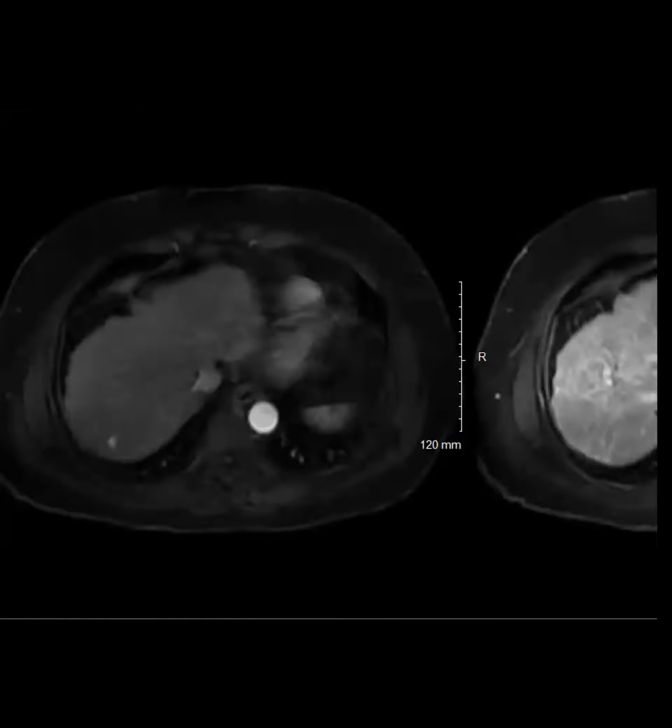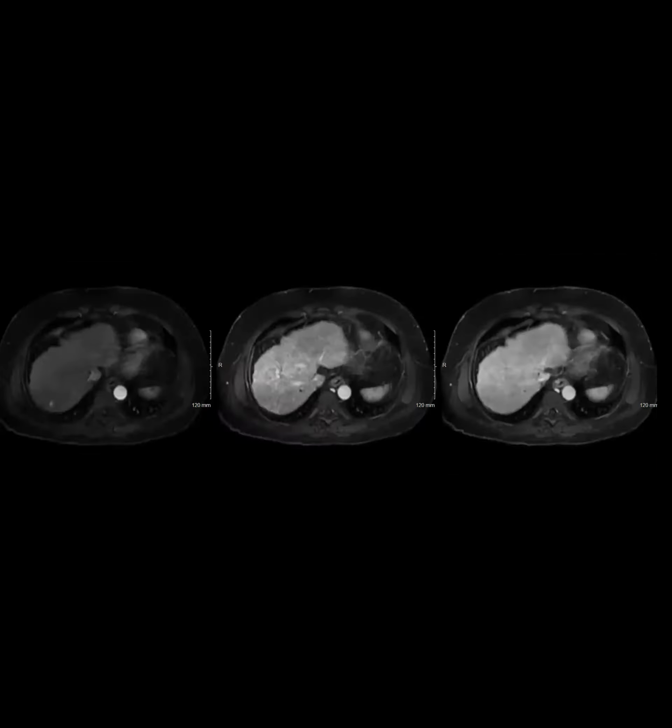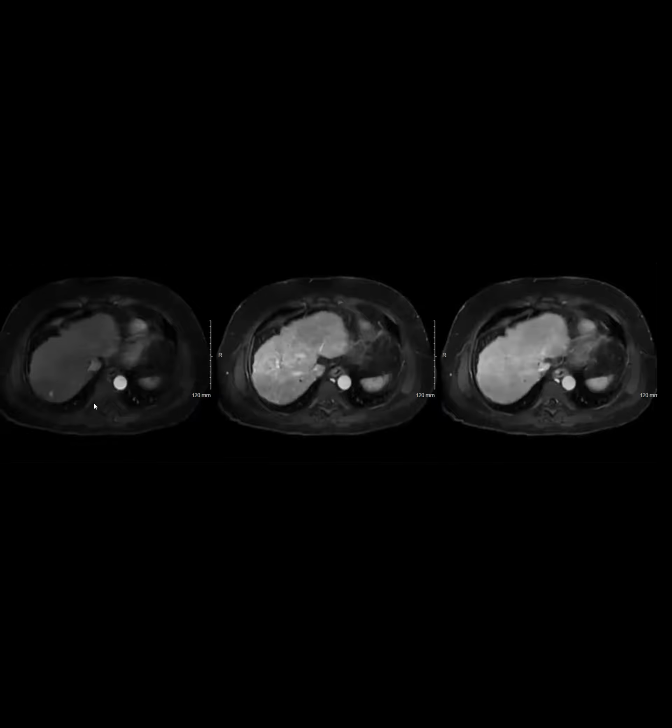So I was just wondering whether we would have put FNH or adenoma, and that would be completely not off. Not FNH, there was clear washout, you don't want to put FNH. But adenomas can do anything. So adenoma for sure, but not if the patient has chronic liver disease. There's no differential.